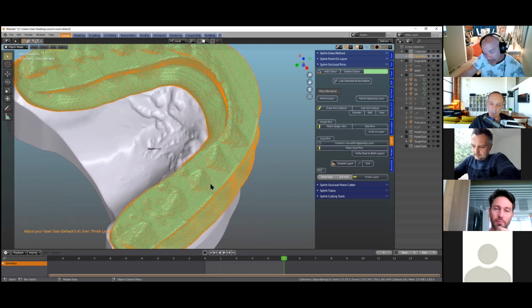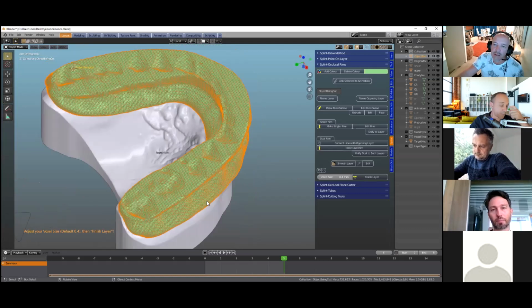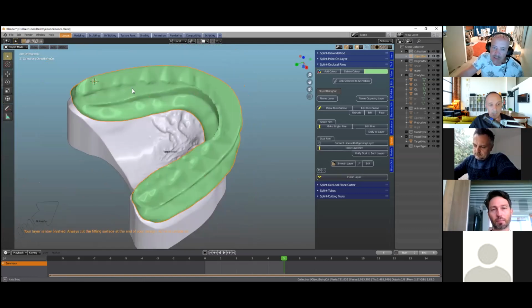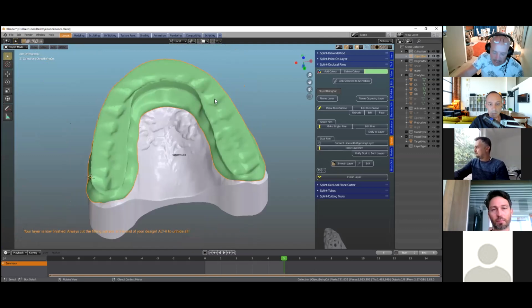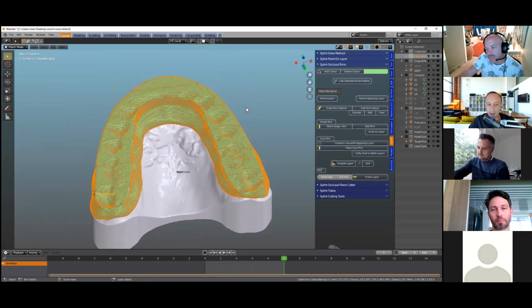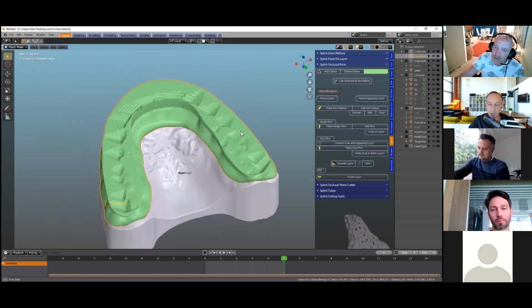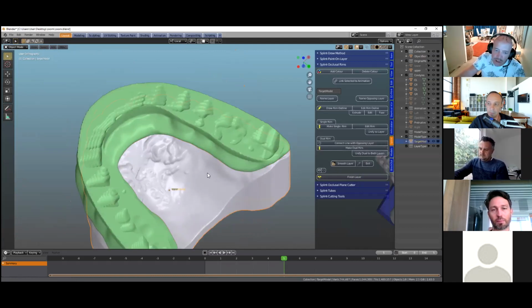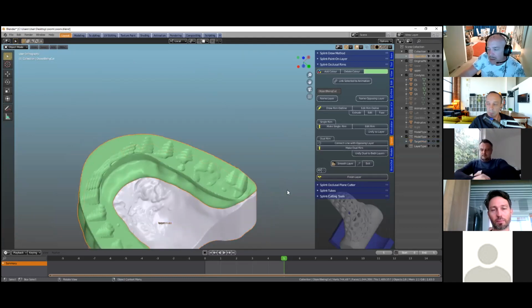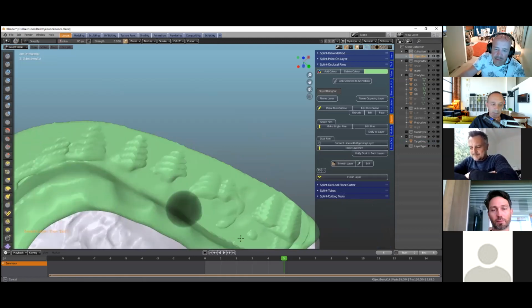So you could go along with that if you are in a hurry and then finish the layer, but you can see the actual cuts have been smoothed. I'll just go back. Smoothing it would take that sharp edge off it. Exactly, because you don't want to hand polish it and so on. We want to get away from the dirty work in the lab with hand pieces and stuff.